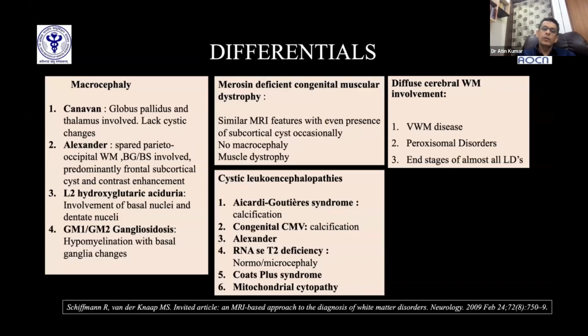Always look at the corpus callosum. The corpus callosum is one of the earliest structures to be involved in MLD. Even if there are milder changes in the white matter, the corpus callosum is involved. Maybe the splenium, maybe part of the body, but it is involved even if it is a subtle involvement. And in my experience, I've seen it involved in each and every case of MLD. Actually, that's how significant it is.